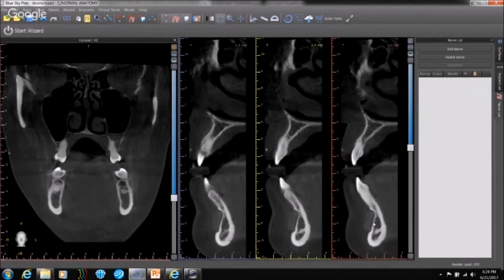Now, this is a little bit unusual because of something else that's happening over here, the soft tissue. But you can clearly see how this whole thing is thinned out, how the teeth have in fact accommodated the area of thinning. Typically, if there are no external factors, unlike over here, this indicates osteopenia.